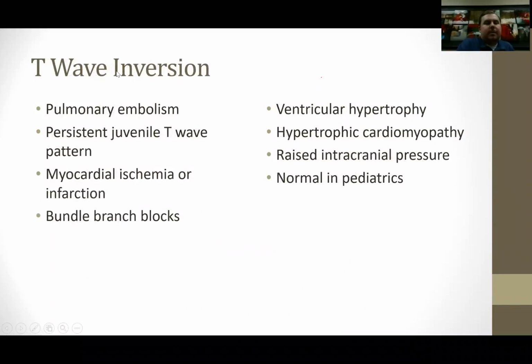T-wave inversion, it could be an infarction or a reciprocal change. Pulmonary embolism causes T-wave inversions in the inferior and right V leads, so 2, 3, aVF, and then V1, V2, and V3.